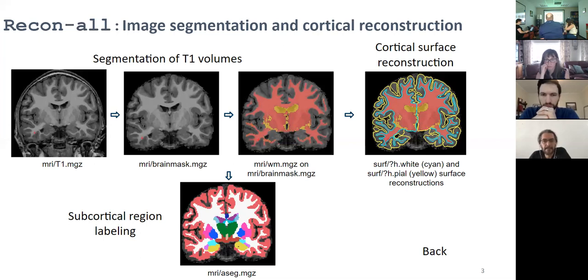Based on some landmarks, we could draw and say everything anterior to this is anterior putamen, everything above this landmark is dorsal putamen. But I don't know that it has commonly used subcortical parcellations just based on T1.